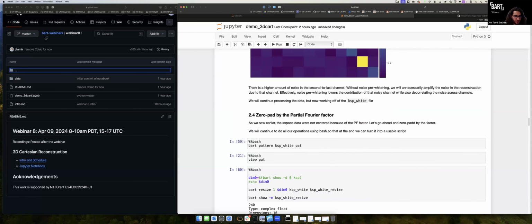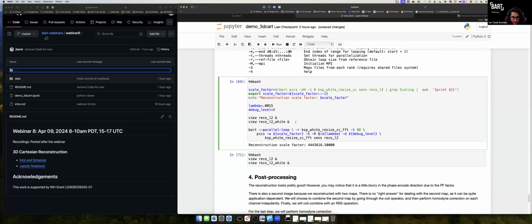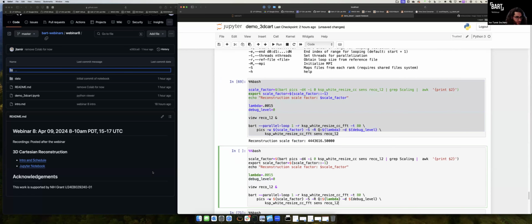All right. I think I'll show one last thing. See if I can get it to do something useful.